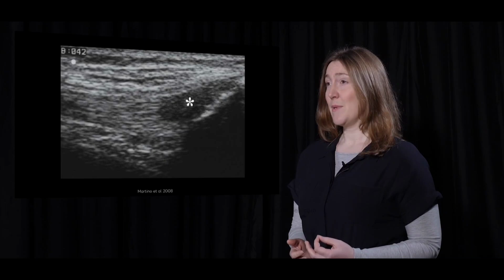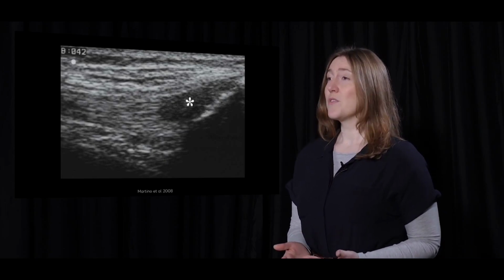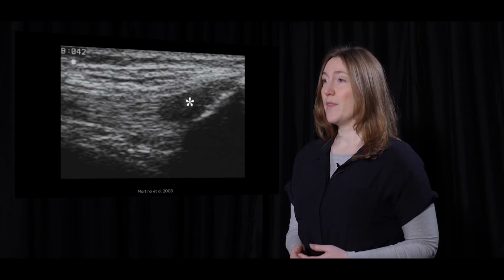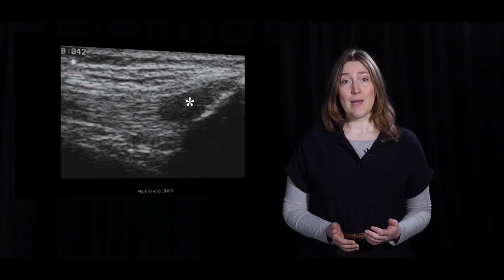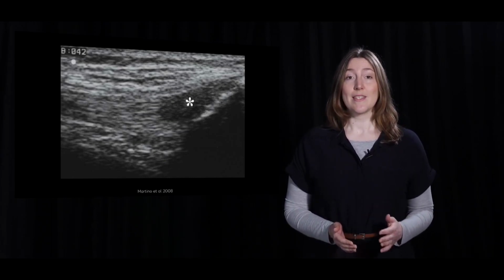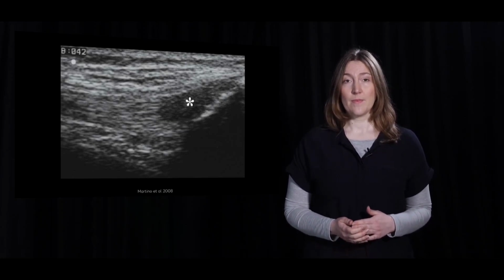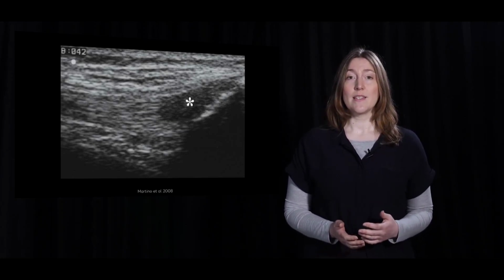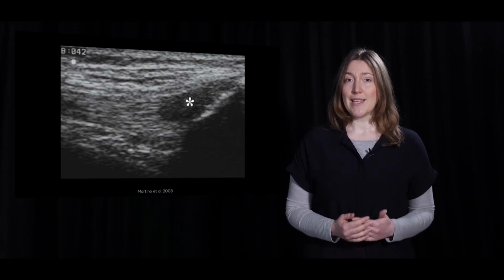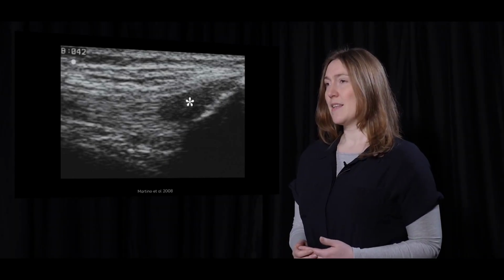The artefact in this image is called anisotropy. Anisotropy means that during an ultrasound exam you don't see an anatomical tissue which is actually there. Because it's a very important message, I will repeat it once again. Anisotropy means that you do not see an anatomical tissue which is actually there. The hypoechoic zone inside the tendon in this image is a ghost image, mimicking pathology, but the tendon fibres are healthy and all present. So how does anisotropy exist?